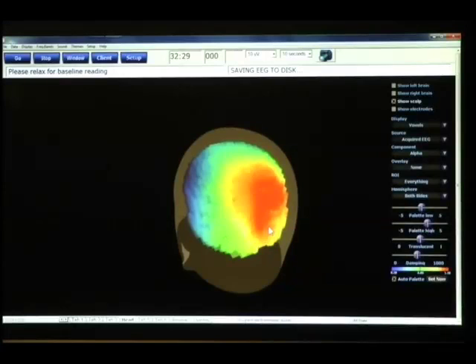Now we're going to review the control panels that are provided with the live Loreta projector, explain how they're used and some of the principles behind them. We do have a lot of controllability, a lot of flexibility in the LLP. And we'll start from the top and then explain what some of the variables are.